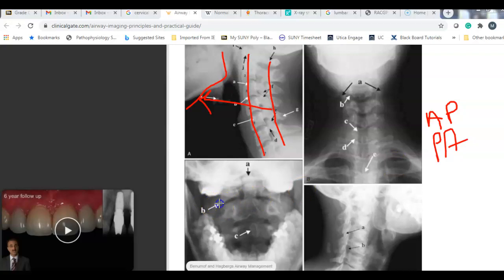This is part of that cervical series where you look in to see, this is C2. Okay, and if you look at the bony anatomy of C1, C2, atlas and axis, they fit snug together. And this is the dens of C2. They can actually be fractured upon severe trauma.